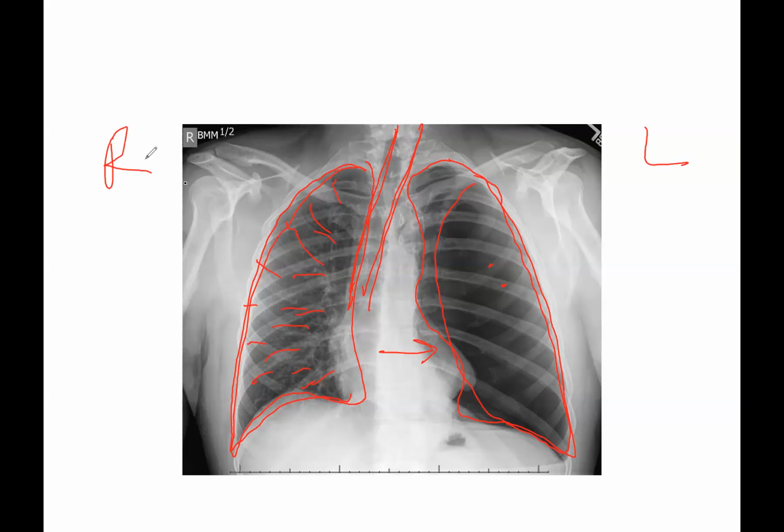What again? Because of the mediastinal shift to the left side. I said this is not left. This is right. Sorry, right side. There's also a depression of the diaphragm on the affected side. No, I'm asking Aminu. I don't want random answers.